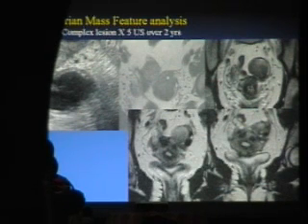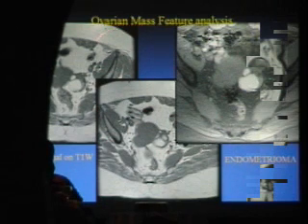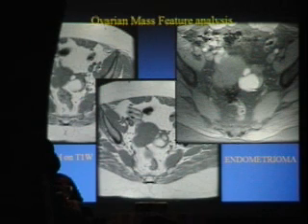What is shading? What does that buzzword mean to anybody? Diagnosis? Endometrioma, great. But you'd love to see your T1s to confirm it, right? So you have to get T1s, because here we have T1 with fat and T1 without fat, and T1 shows us that there's high signal in here that did not suppress. Therefore, it's not a dermoid or teratoma.